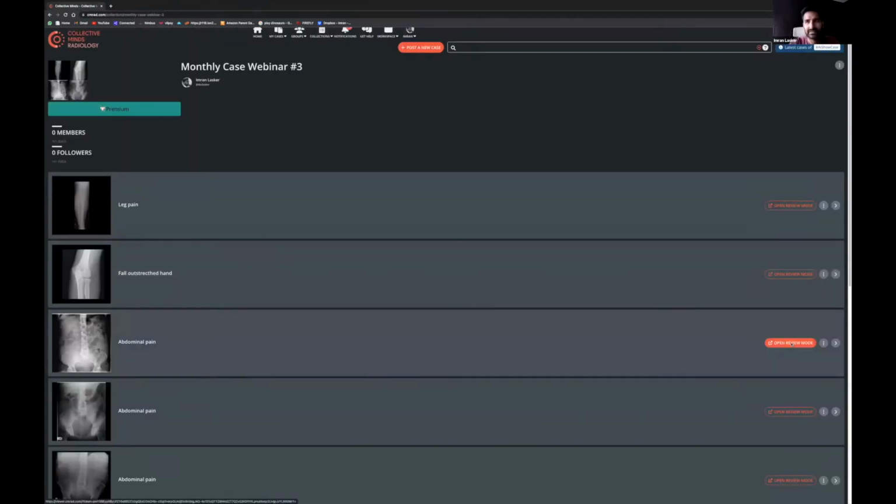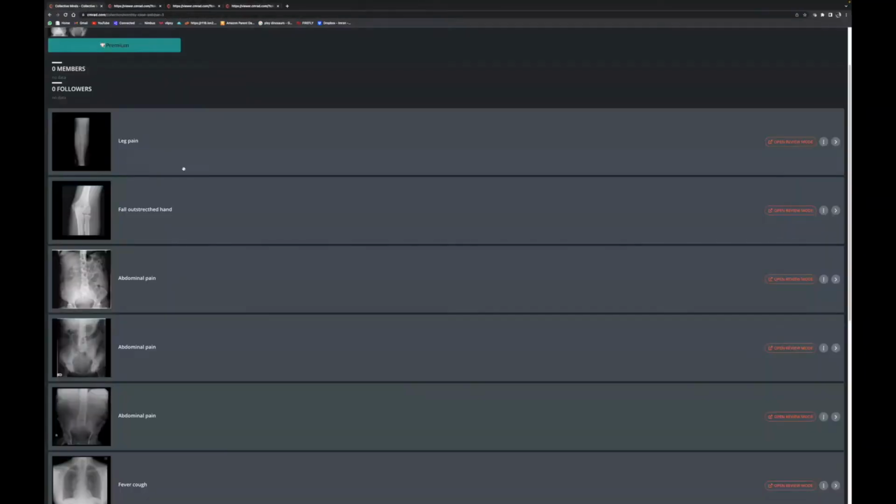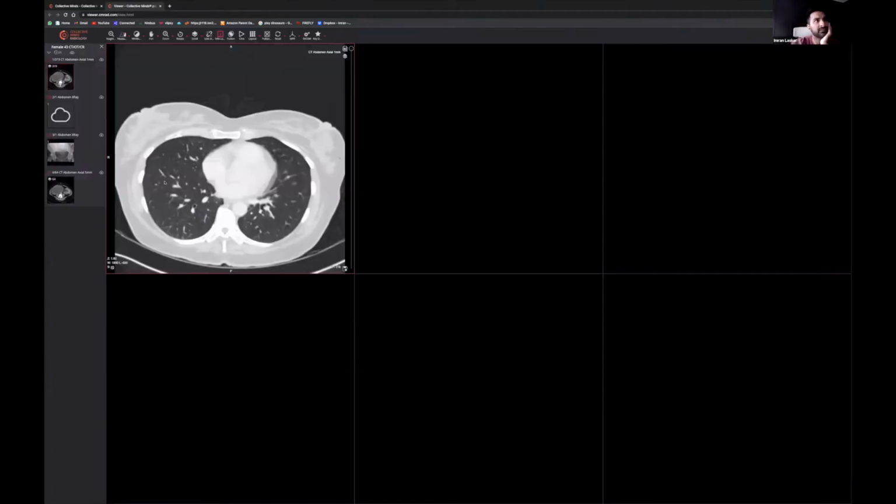Yeah, I'm sorry that some of you aren't able to open the abdominal pain ones, but I'm going to open it now. It may take a couple of seconds while I do that. I'm going to open a couple more in the background so that we don't have any delays between cases. Okay, that's taking a while to load up. Iman, it's recommended you can only open one viewer at a time, so you can't tab like that. Okay, fine. Let's have a look at this one.